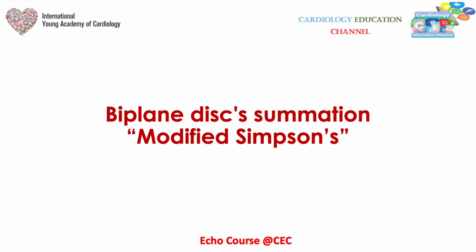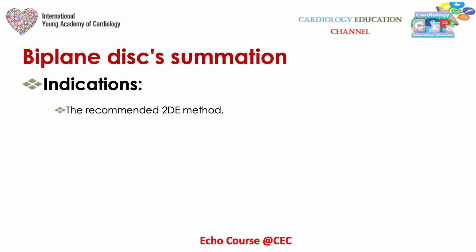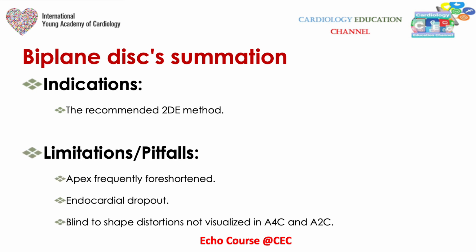The biplane disk summation, or the Simpson method, is the recommended 2D echocardiography method for assessing the ejection fraction by the American Society of Echocardiography guidelines. So this is the recommended method for assessing the ejection fraction, or the LV systolic function, by 2D. Also, it comes with limitations and pitfalls.